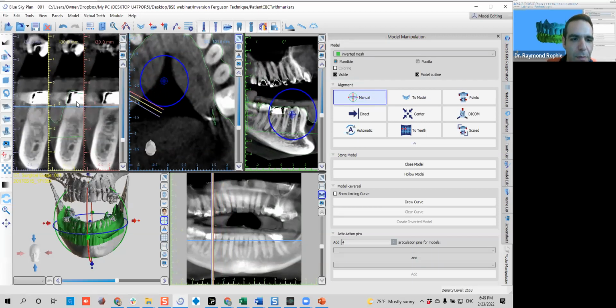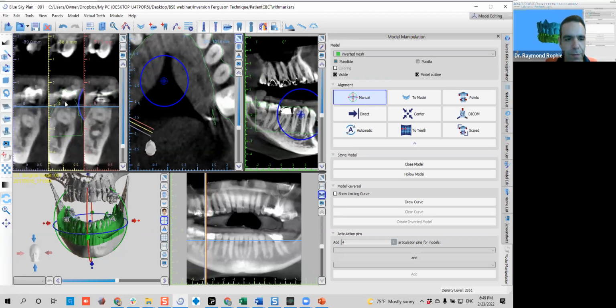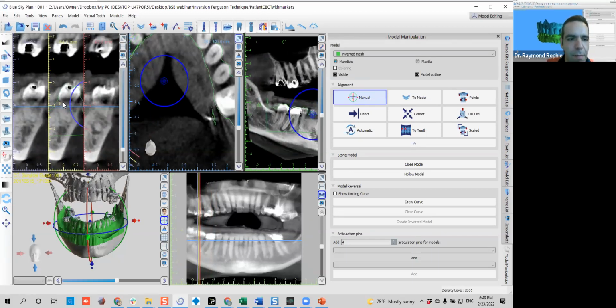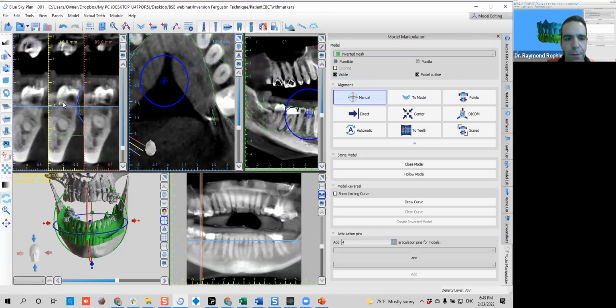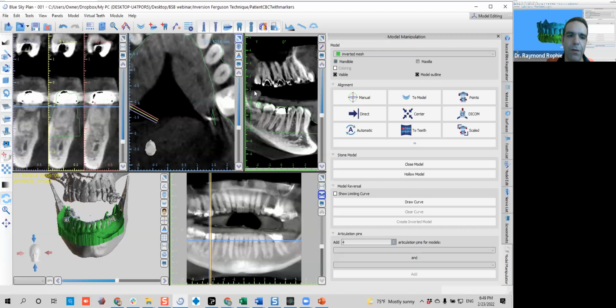Okay, at least it's not only 1 point. And that means that if you don't have enough space and you want to be very, very precise, now you have a very precise alignment. Okay, so try to do the least amount of all these movements, because trust me, you can be there like hours trying to align one very small thing. So you need to be critical, but good critical on how to align. Okay, but also very specific on how to check if this is right or wrong.